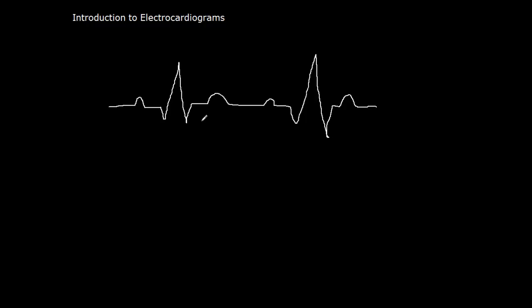Here's my very amateur attempt at writing an exaggerated ECG waveform, but it'll be enough for you to get the idea of what I'm talking about. So the first thing I'm going to do is just label the important waves and intervals. Now I'm not going to be covering everything, but I'm going to be covering, just like I said, the very basics for you when you start out on the ward.